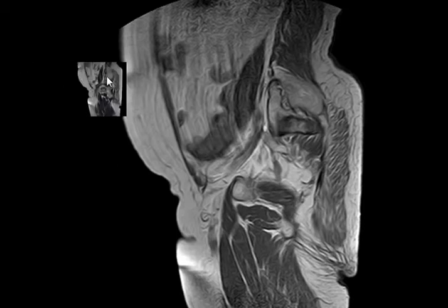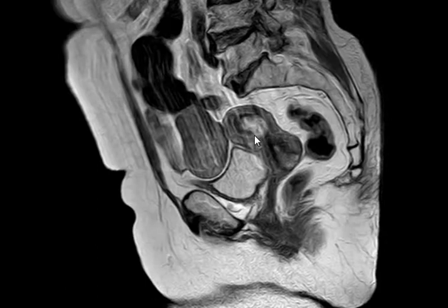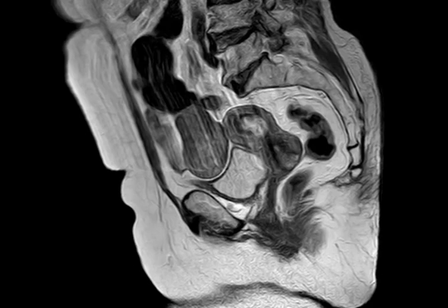Let's go to the T2. Fat suppression or T2, doesn't matter. You can see fluid signal intensity within the endometrium, and it's a thick one. Third, the aim here is for local staging. Is the junctional zone intact or not? No, it's not. You can see it here, it's present, while here it's missing, and here it's missing. So this part of the junctional zone is invaded.